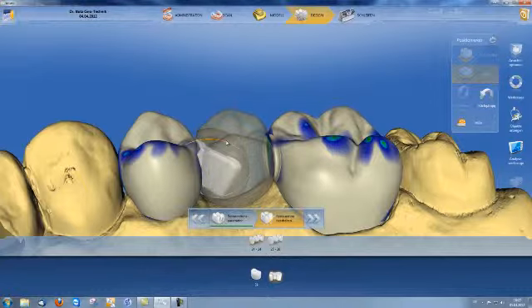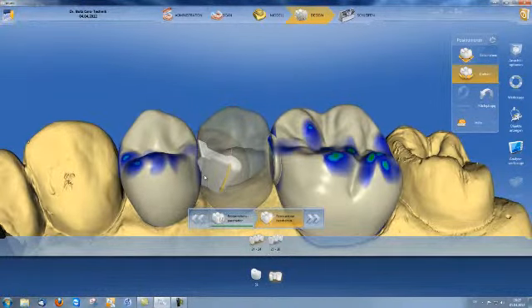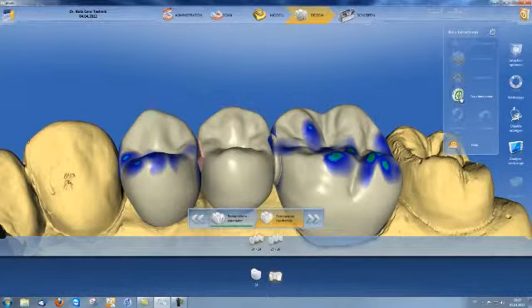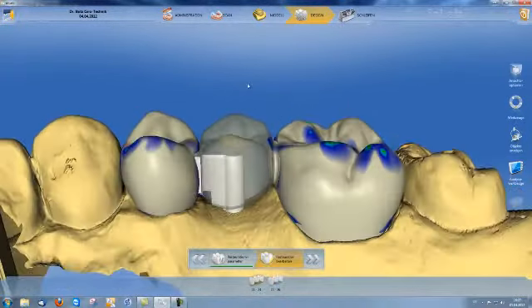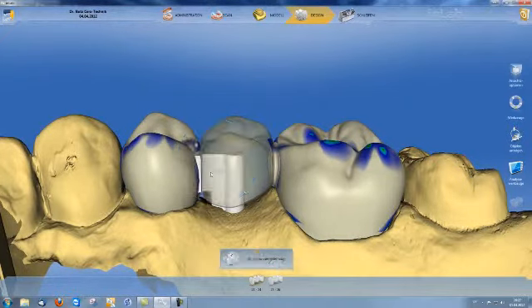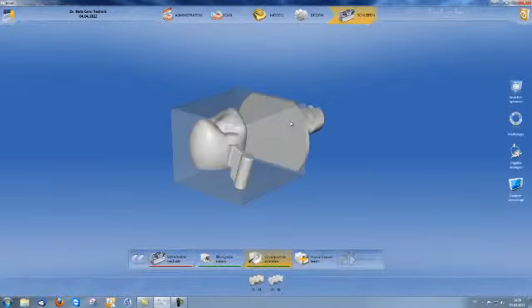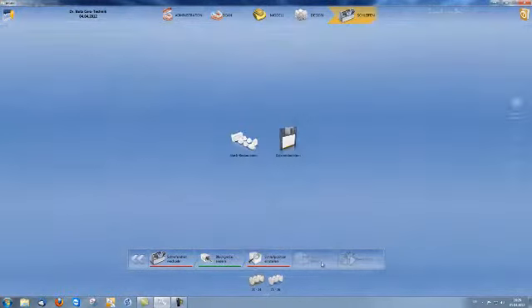If the attachment is completely displaced, i.e., it is out of my telescope angle, I can activate Recalculate with a right-click, and this is recalculated in the first proposal. I then activate Create Matrix and can mill out my divided attachment in the milling preview, or alternatively export it in order to mill it using the Stack software, or to save it as an Infinident file.